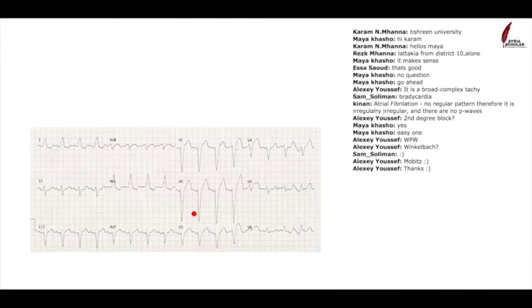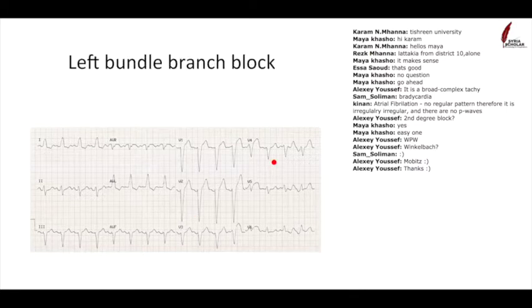Okay. So, most of you thought this is left bundle branch block. And the answer is left bundle branch block. So you're all absolutely correct. And the way that we work this out, like we said before, V1 looks like a W, it's pointing downwards, versus V6 looks like an M, it's pointing upwards, and this is our left bundle, it's William. Or a better way to think about it is that V1 is negative. And V1 is pointing down, it's left bundle.